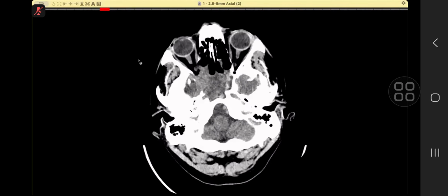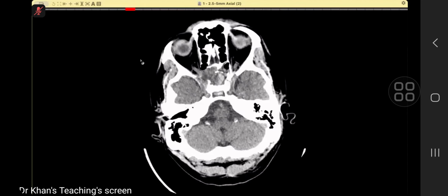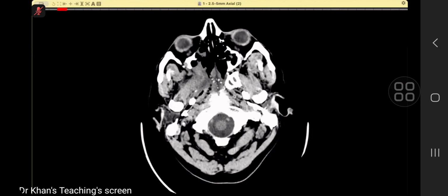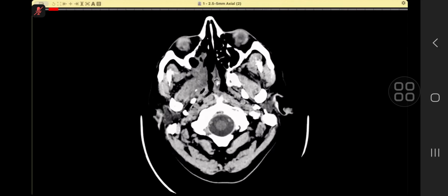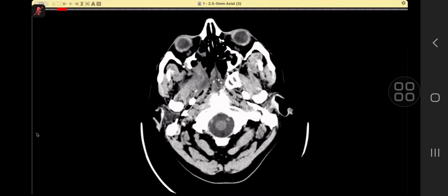Please remember that today we are in the world of base of skull, but in the exam world, you have to really make sure that you pick it up. So there is something huge happening here. The candidate did very well, asking for the bone window. Ultimately got the diagnosis also, but a bit of fine touch about anatomy, which I will point out.